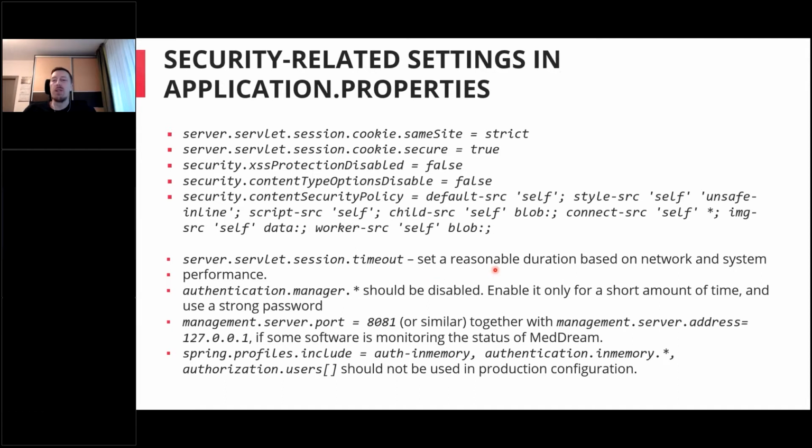Another thing to mention is the session timeout. It is recommended to set a reasonable duration for the system timeout. Also, if you run a production server, it is recommended not to use the authentication manager or ports, or the in-memory users and all this information.